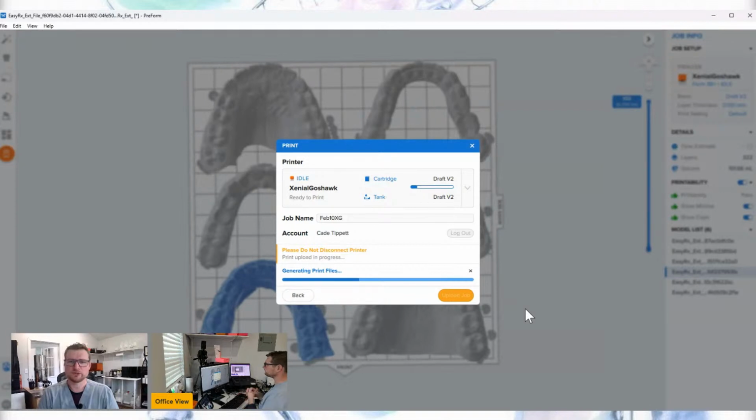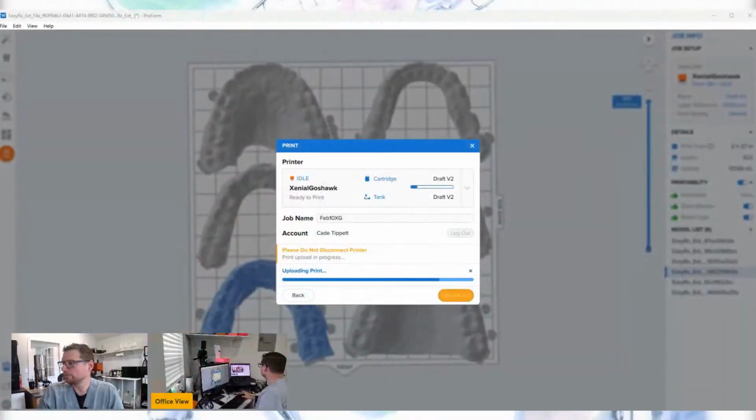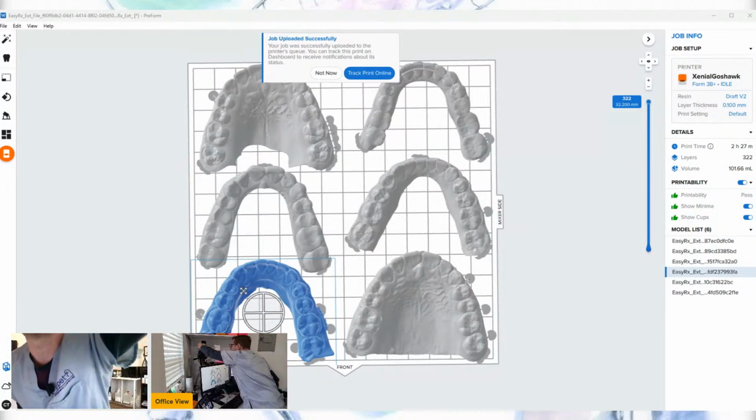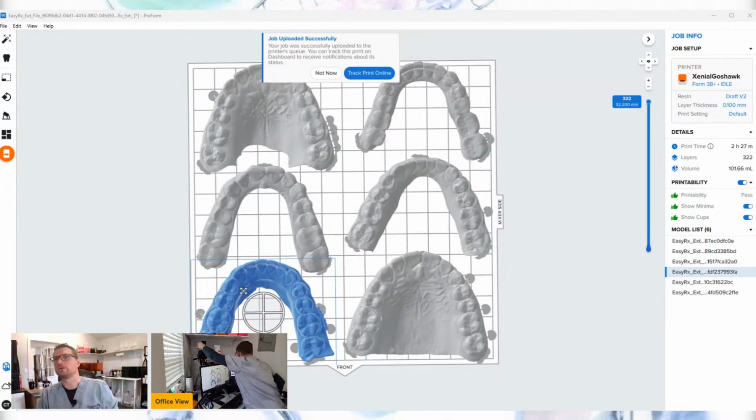Actually, over there, go back. Yeah, it's sending it to that printer. All right, let's go back to here. Oh, this is taking a while. Again, drink. All right, let's see if I can add an extra camera here. I know this is a weird view of me.